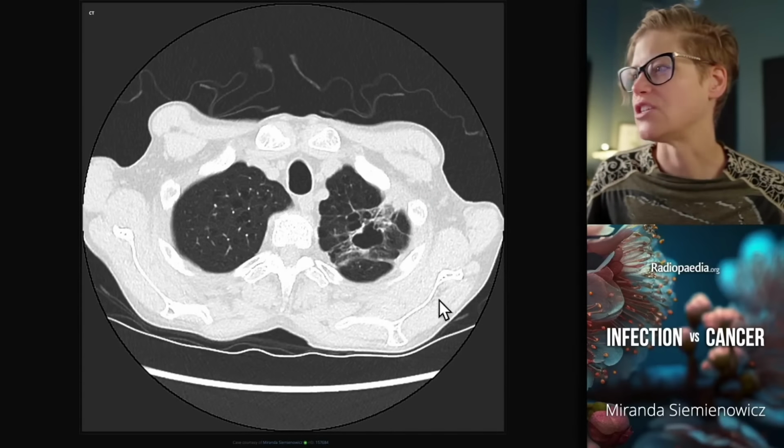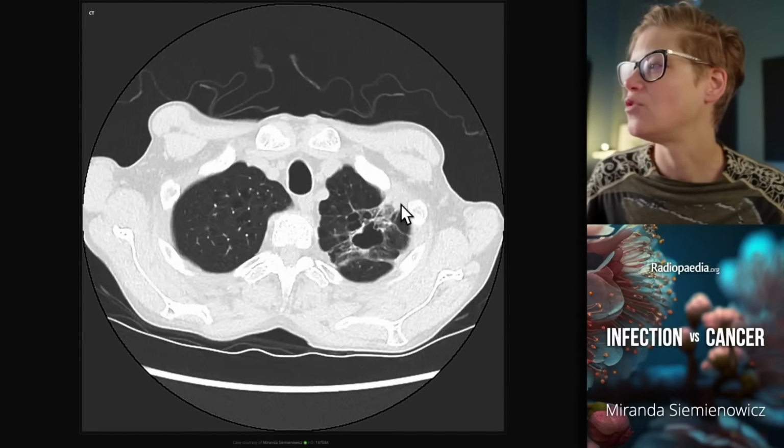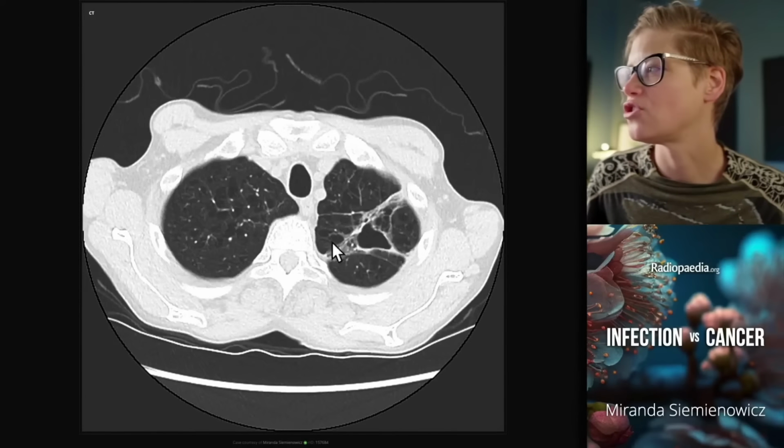And sure enough, when we follow this lesion up, the mucus clears, the patient has a cavity that's probably with them for life, and a few post-inflammatory bands to show for their efforts.